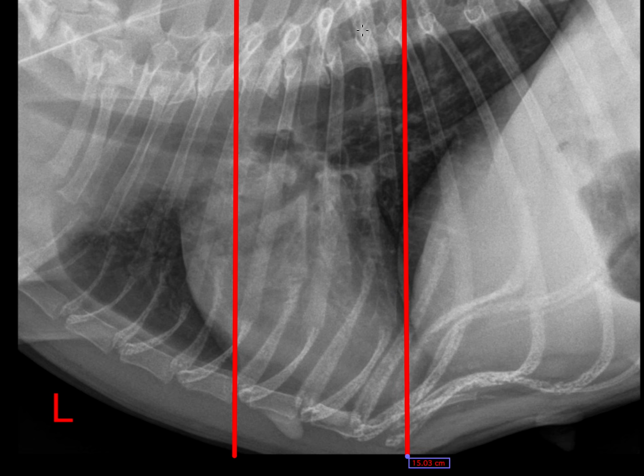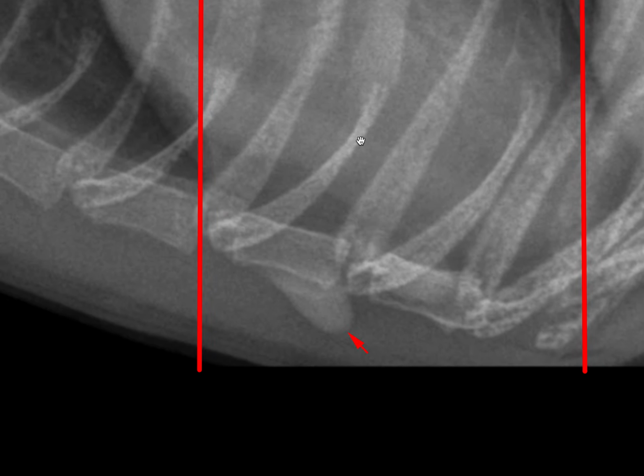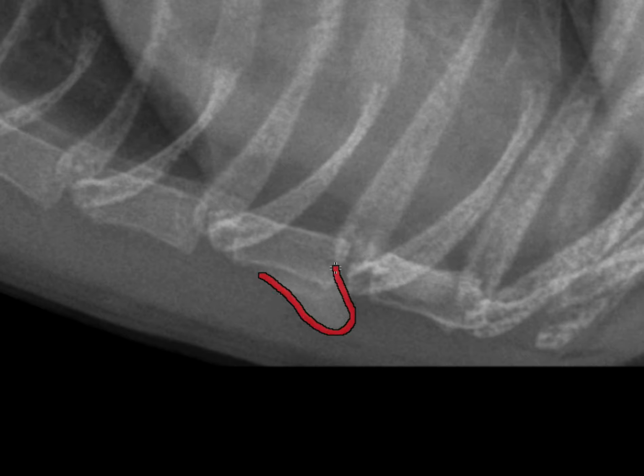I look very carefully at the lungs, and I cannot see any nodular structures anywhere in this or the other lateral view. However, I can see the lesion. Did you spot it? Right, it's down here. Can you see it? Let's zoom in on that. If you look very carefully, we can find some of the main features that we saw before. It's got a very sharply defined margin here, but not all around it. And considering its position, this cannot be in the lung.